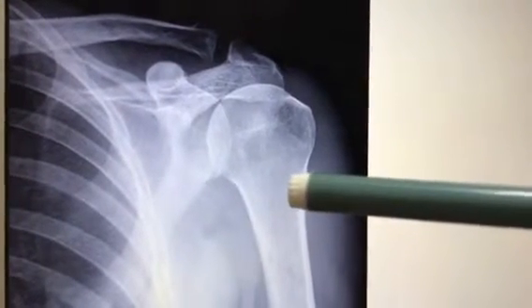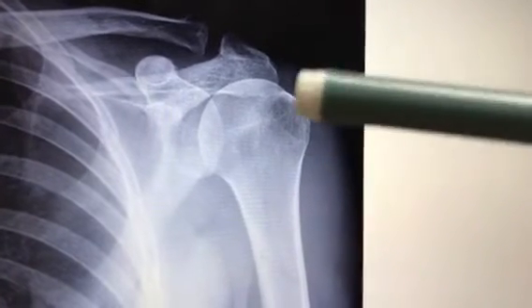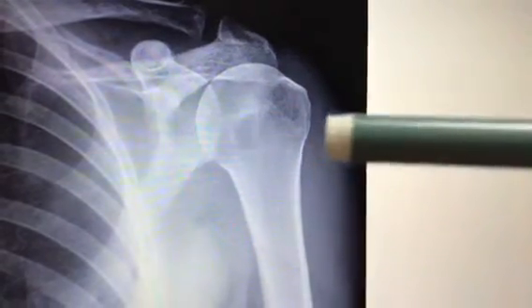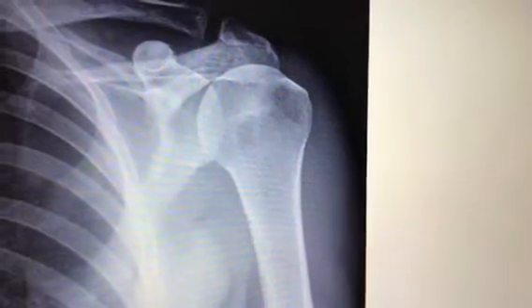A fast review for the radiology x-rays. When the radiology x-ray is given to you, you have to answer three important things first. Number one, which view, whether it is a plain x-ray or contrast x-ray, and which area.